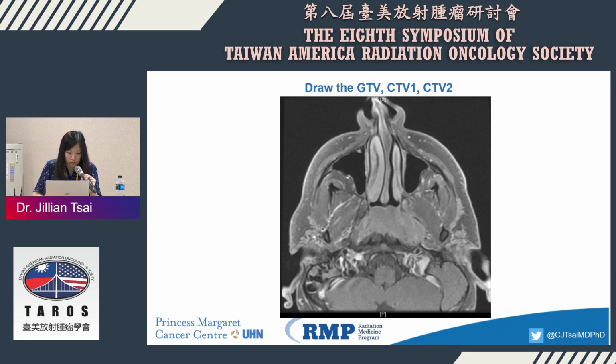So I will attempt to draw the GTV here, and then the CTV1 and CTV2. The GTV is obviously the gross tumor, and there are two ways of doing it, and I'll show the Memorial Sloan Kettering method.